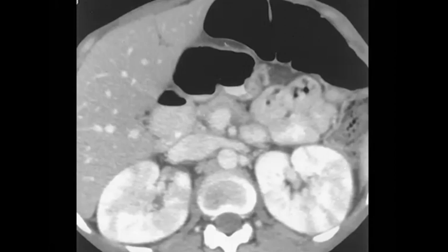I see that Rehan also suggests a good differential, that it can be renal vein thrombosis. Yes, ureteral obstruction, perfect. So obstruction, venous thrombosis. It can also present with a wedge-shaped appearance. If it is non-enhancing, it can be infarctions, perfect, multiple infarctions, hypotension, yeah, medullary sponge kidney. We have many things.